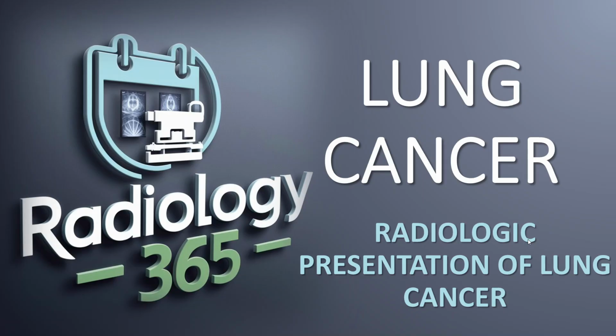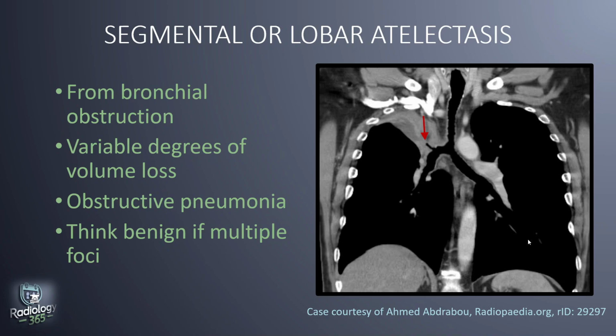Still on the topic of lung cancer, today we're going to be talking about the radiologic presentation of lung cancer. This is basically a summary of everything we've been talking about in the past, and we are going to look at what things should point us towards the possibility of a lung cancer in general. So the first thing we'll talk about is segmental or lobar atelectasis.